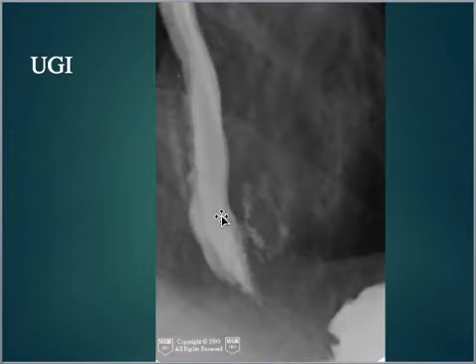This patient actually has barium leaking from their esophagus. You can see here, it's nice and smooth lines coming down. And then once you get to right about here, it's just a very small leak, but it's leaking out of the esophagus. So if they used barium sulfate on this patient and not gastrografin, that patient would probably have to go into surgery and have that cleaned out, depending on how much it was. This could be from a disease or injury. I'm not really sure what the cause of that rupture was.